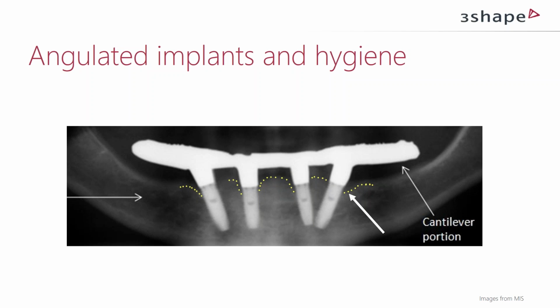I wanted to show you all these different variations inside Implant Studio, but we have already been talking for about 45 minutes, so I think this is a good way to say that this was the first part on basic considerations. In the next part we could actually do all these placements and look at how they work inside Implant Studio, so I may show the tools and how we can work with them on a daily basis.